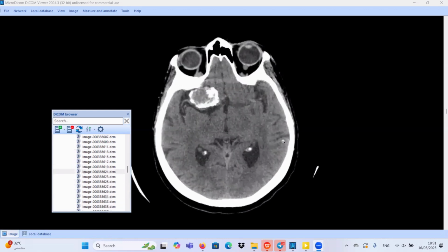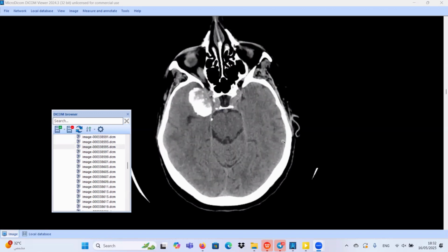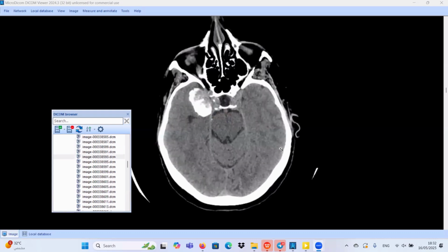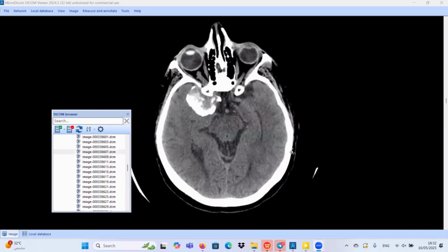The lesion also is very close to the M1 segment of the right middle cerebral artery. The lesion is intimately related to the cavernous portion of the right internal carotid artery medially. So, in conclusion, our 2 top differential diagnoses in this case: first, meningioma; second, giant saccular aneurysm arising from the internal carotid artery.